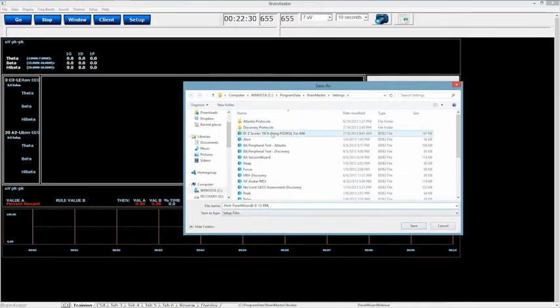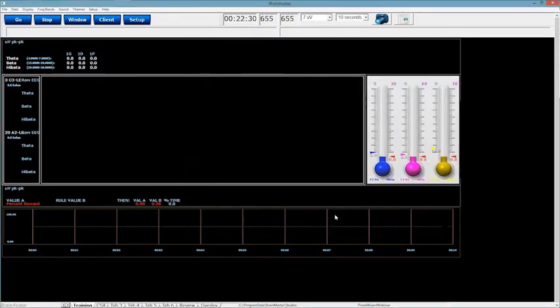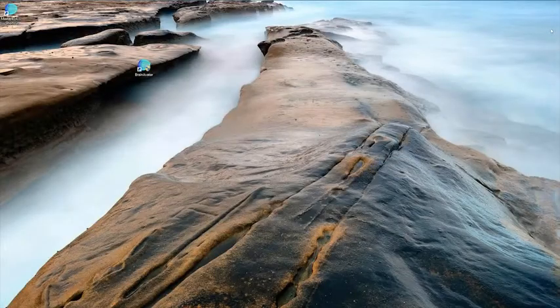Of course, the nomenclature that you guys use for whatever your protocols are is going to be whatever works best for you. And I recommend sticking with whatever works best for you on that one. So I'm going to hit save. And then, of course, whenever I would build a new protocol, or if I double-click to my thing, I would now use the settings as they're set up right here. And that is the panel wizard right there, pretty much for those.